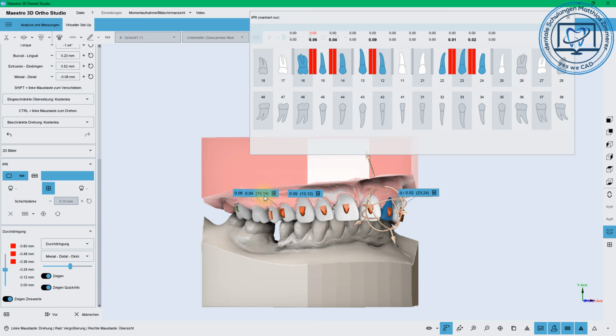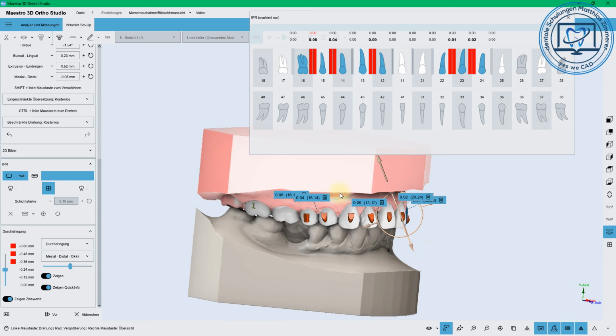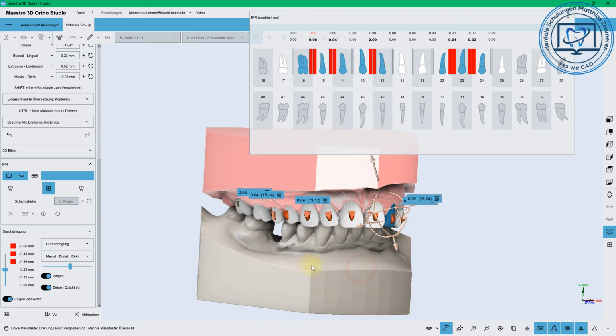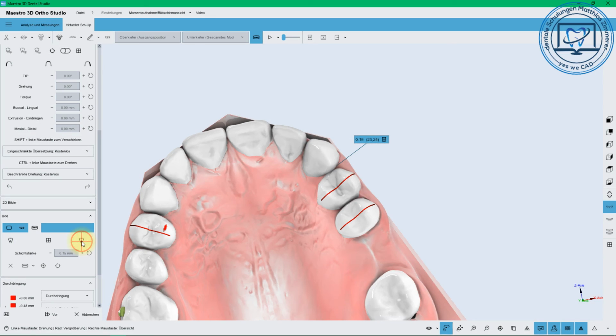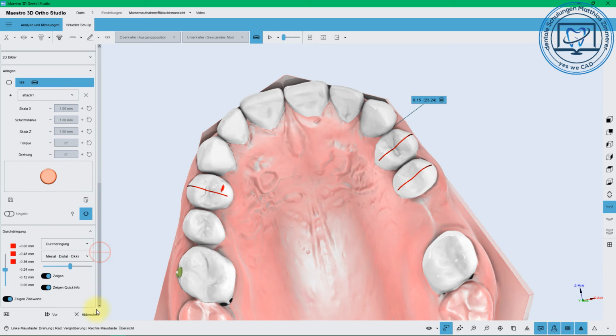Yes, the other thing is you will see the saw, and yes, but do we really need this? I don't think so. I think it's enough to give in the numbers and have the space and just make the setup good. And this is the better way, I would say. And the next thing would be the attachments.